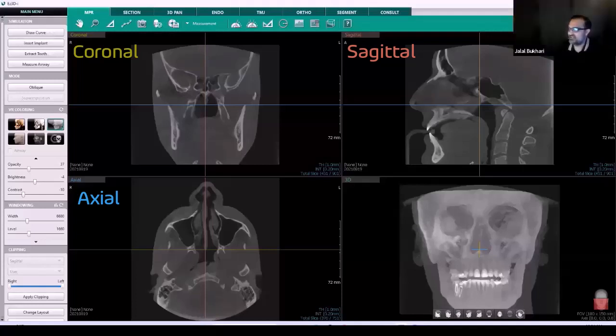Absolutely. It's of great value to systematically review a cone beam CT volume and familiarize yourself with the general anatomy of the maxillofacial structures, get accustomed to what seems to be normal or abnormal, and understand the limitations of CBCT imaging. So systematic review of a scan can vary from practitioner to practitioner. Whenever you look at a cone beam CT scan, you want to keep a consistent viewing sequence every time. And keeping such a habit can bring about efficiency and thoroughness in reading your scans.